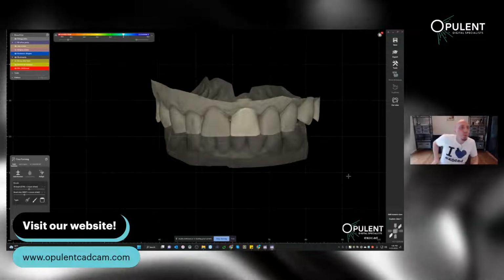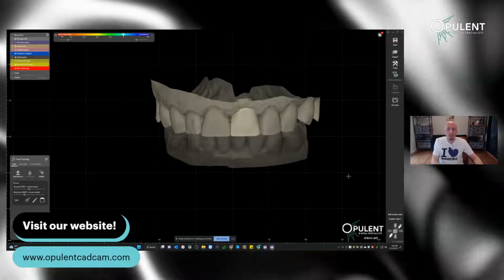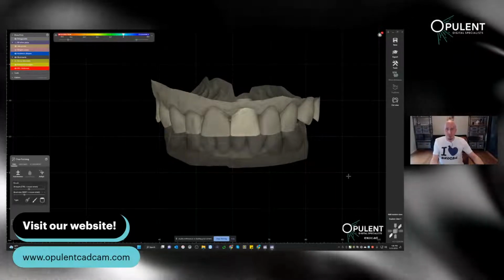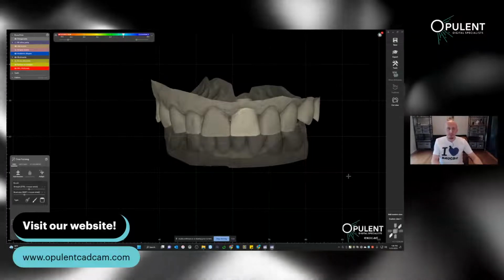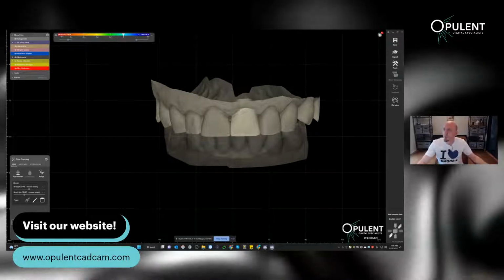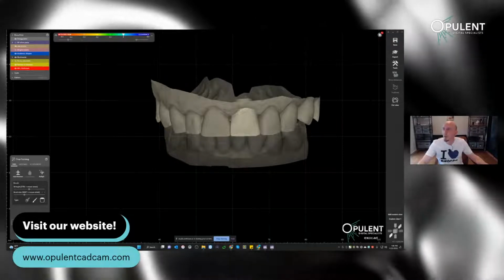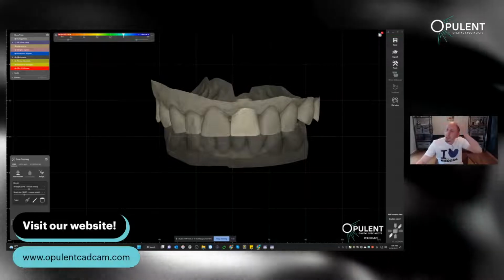We're not looking into full edge cases or anything crazy here today. I just want to give you an overview of what the module does, what kind of options you have with it, maybe make a quick design here, and be here for questions. And talking about questions, I'm going to try and peek at the chat.